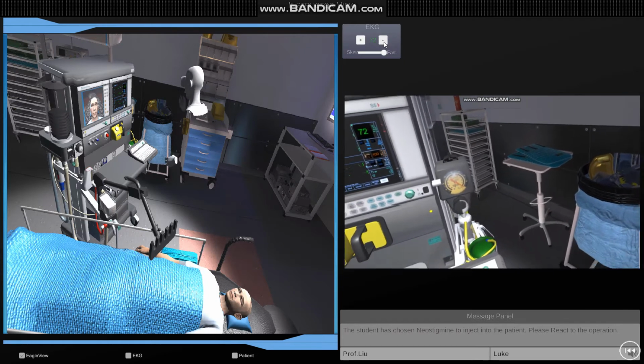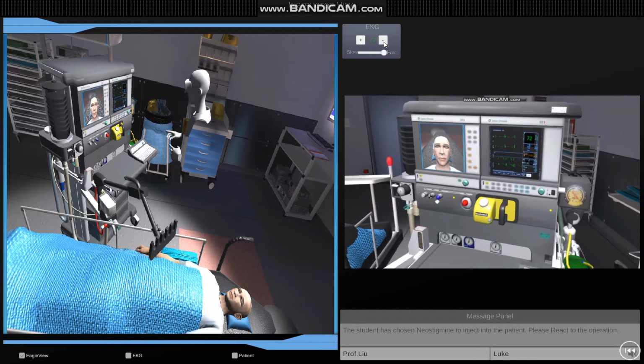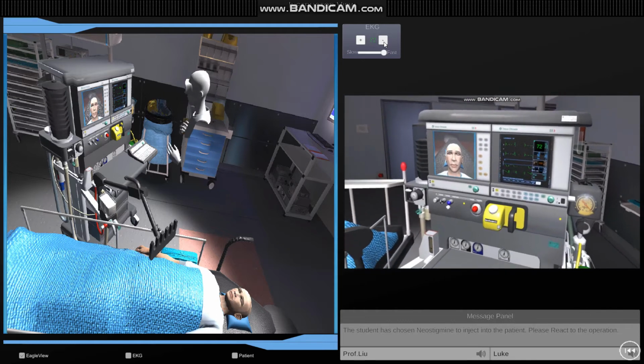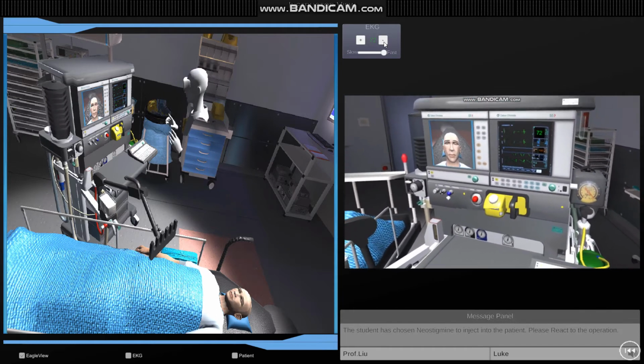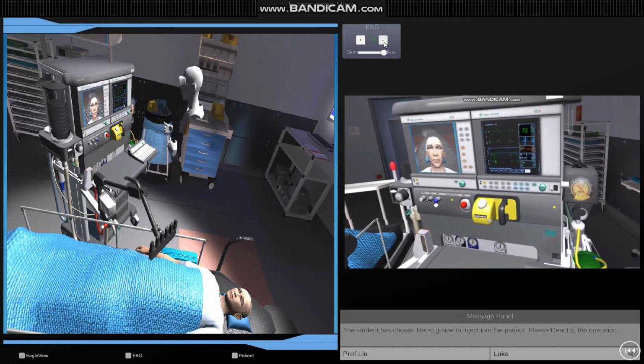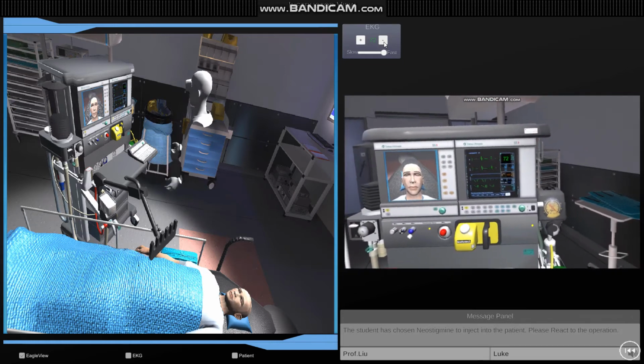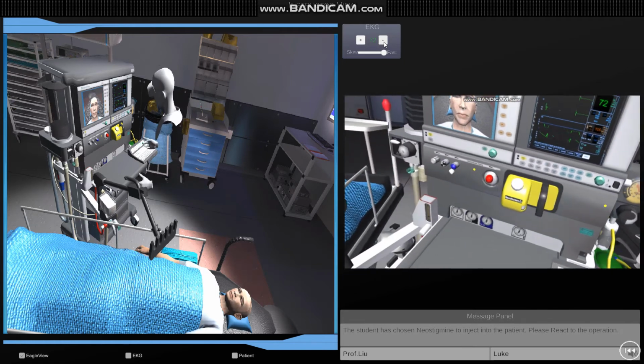And also the other side, the student VR view avatar on the instructor side. So let's get to the next level, plan B, where we're going to use a normal PC. We don't have the Oculus Rift anymore. What if we don't have the headset? Then we can always use the PC. Okay, let's do that.